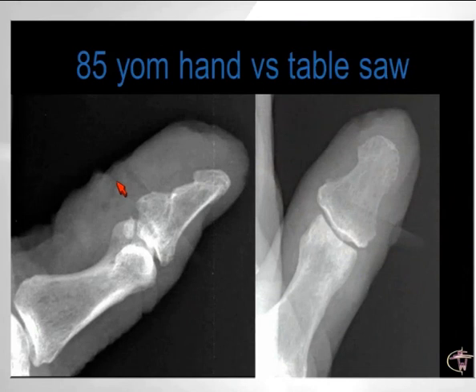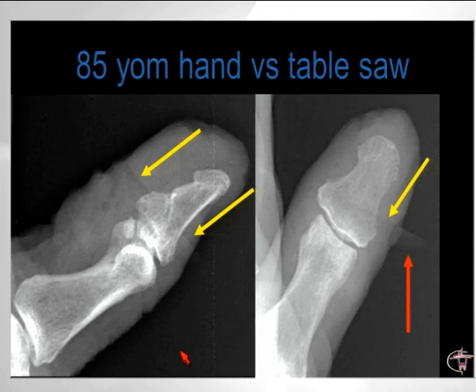Here's a clinical correlate of what you might see, a clinical example. This unfortunate man had an encounter with his table saw. He severed the tendons of his index to small finger, but in his thumb you can see that there's also a barely visible, slightly radiopaque foreign body that traverses the soft tissues of his thumb from the dorsal aspect to the palm. The physical exam is helpful in this case because it's sticking out on the side.